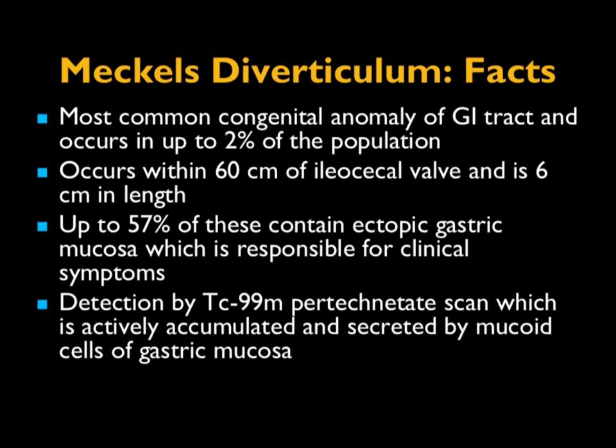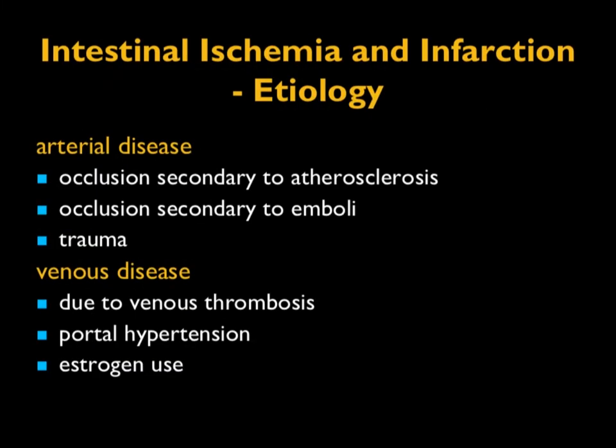So it's something to think about. It can be a very important diagnosis. If you don't think about that possibility, you're just simply going to miss it, and that indeed can be very problematic. So let's look at a few other things.